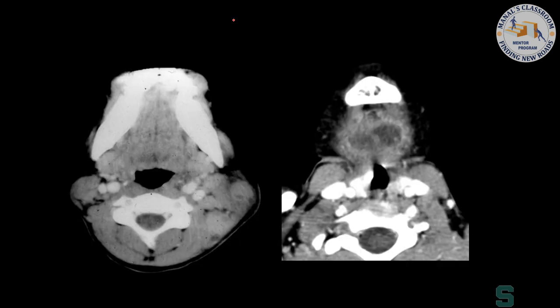Okay. So this is an example. This child comes in, and you may see this in Egypt. I don't know. This child, what's that? Not Ludwig's, no. But remember Ludwig, think about that. That's going to come up later. This patient has a localized group of lymph nodes involving the left-hand side, and in this case, a different patient has this group of lymph nodes that's more suppurative in what space? Submandibular. You're experts in the spaces now, right? So, what do you think the diagnosis is going to be there?